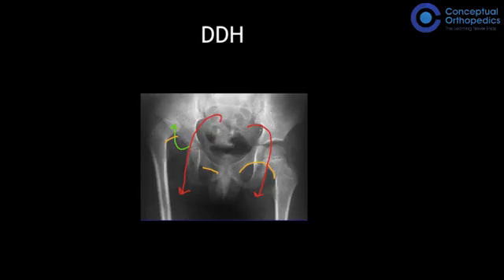The size of the epiphysis is smaller. The acetabulum is shallow, unlike the properly curved acetabulum of the normal side. So shallow acetabulum, small epiphysis, broken Shenton's arch, vascular sign of Narath, and positive supralateral displacement are the features of DDH. But right at the core of DDH is the shallow acetabulum that one should remember.